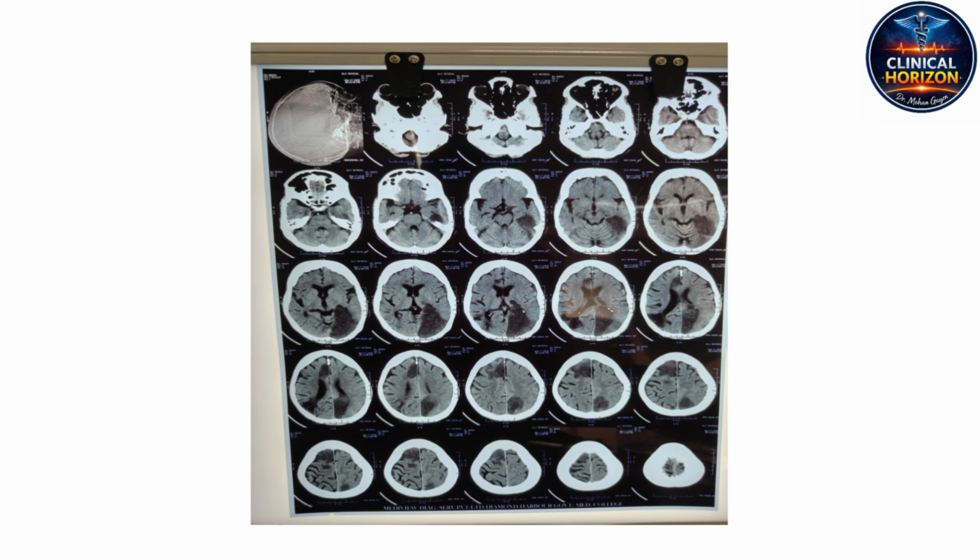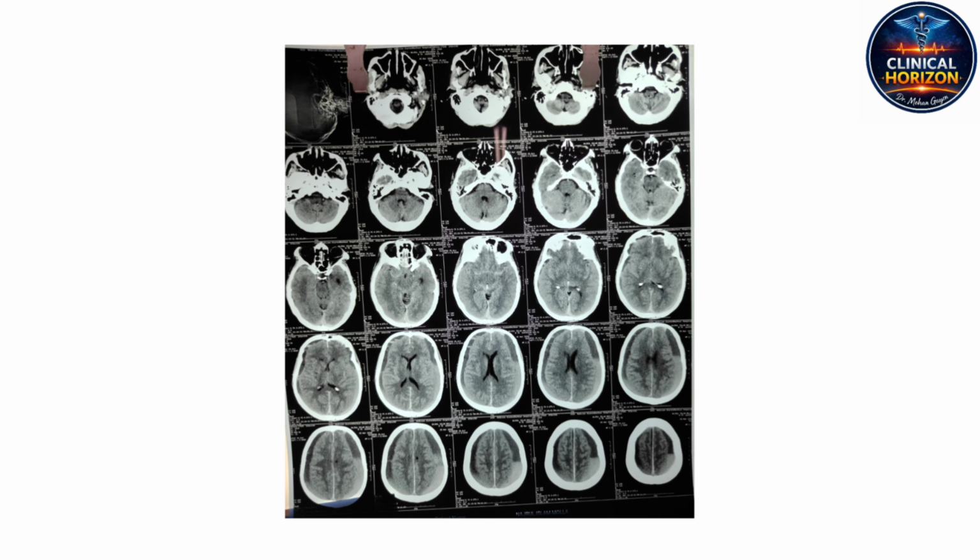So the brain just makes it up? The brain, abhorring a vacuum, simply invents the visual input. It perfectly underscores why mapping the exact anatomical boundaries of the hypodensity on the CT is so vital. It predicts these complex, seemingly paradoxical clinical behaviors. Here's where it gets really interesting. Moving from deep parenchymal lesions, let's examine extra-axial hemorrhages. Surface bleeds. Scans 6, 7, and 8.